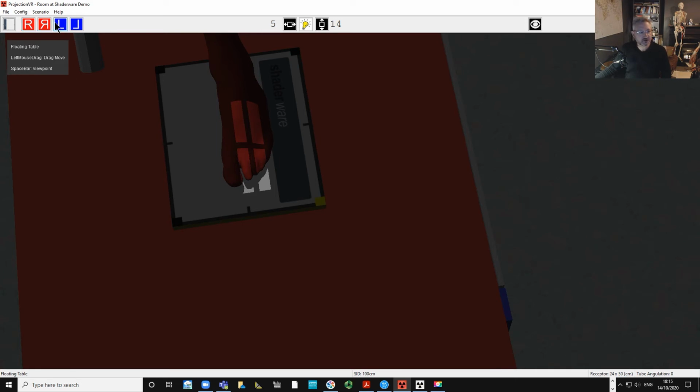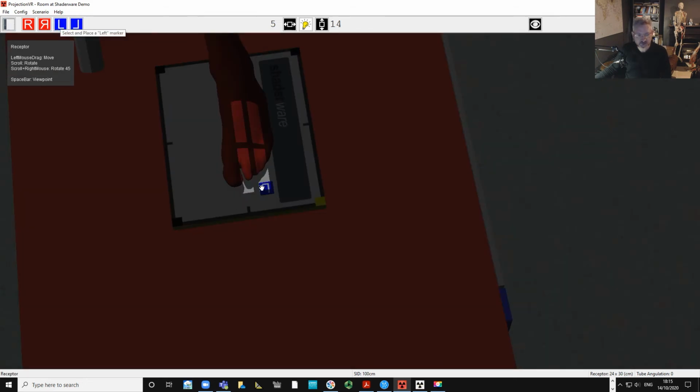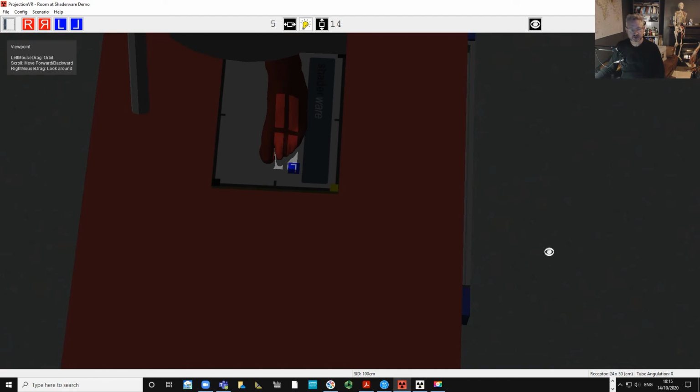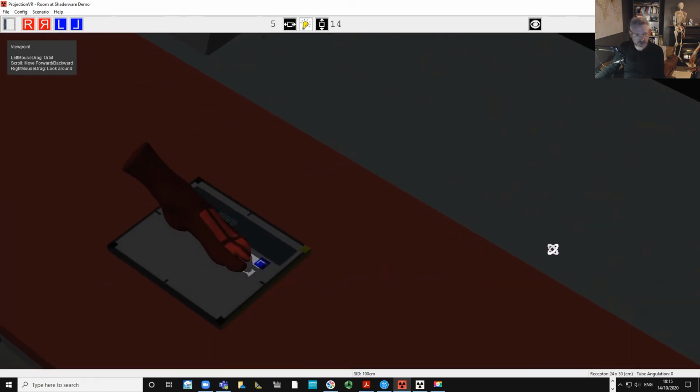Now I'm going to try and put a marker on, and we want to put the marker on the lateral aspect, which is over here. And as you can see, it's going to be tricky to get this marker on while keeping the collimation small. We've just about managed it though, so that's fine. We don't want it to actually go over the bones, so more soft tissue really. So that's fine. So now just have one last look just to make sure everything's okay.